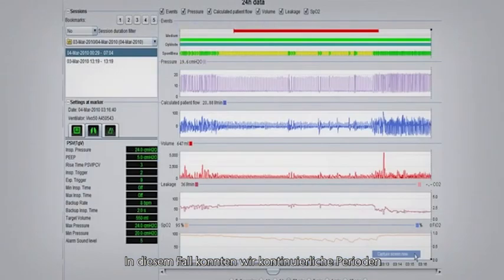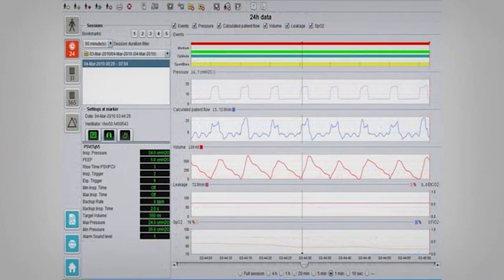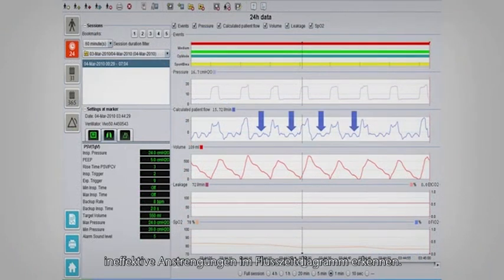In the records, we could appreciate continuous periods of oxygen desaturation during the night. These periods corresponded to tracings with marked reduction in inspiratory flow and absence of assisted breaths. All the cycles were controlled. In the 1-minute screen, we also could detect many ineffective efforts in the flow time graph.